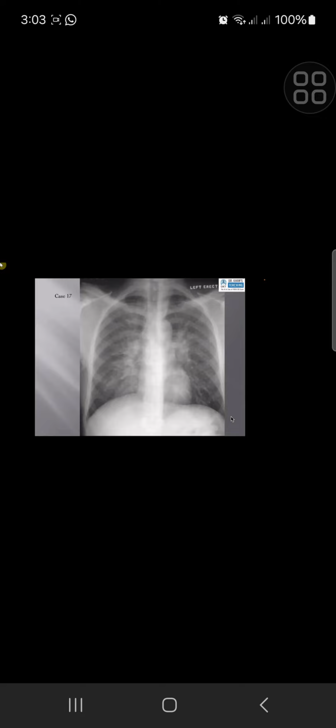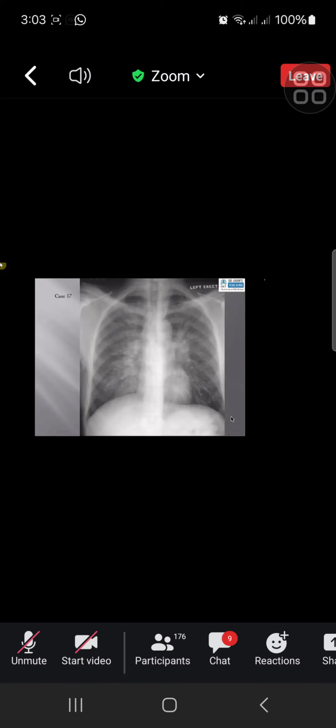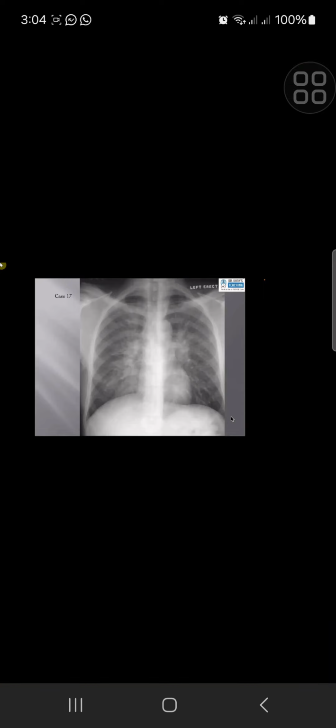There's increased bilateral hilar shadowing. There's increased central bilateral perihilar shadowing and increased opacification over the upper and mid zones with horizontally placed interstitial opacities, suspicious for Kerley B lines. There are no pleural effusions. I can also appreciate upper lobe vasculature diversion. Appearances are most likely secondary to pulmonary edema.